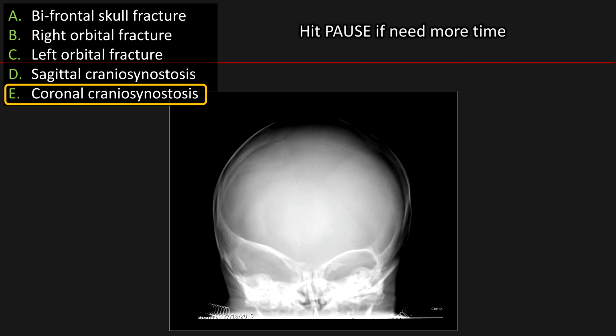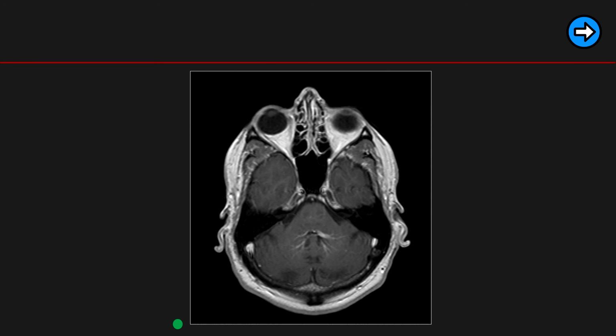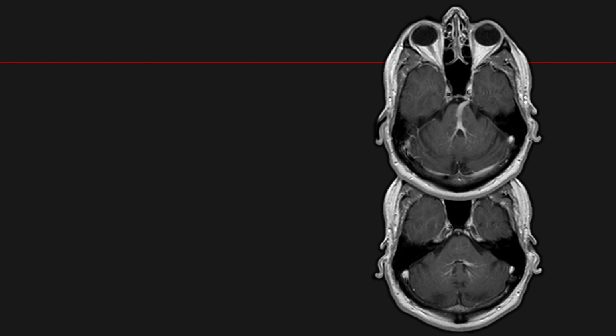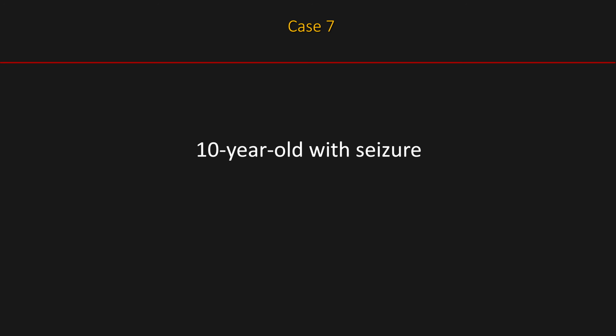Coronal suture craniosynostosis. Case 6. DVA.